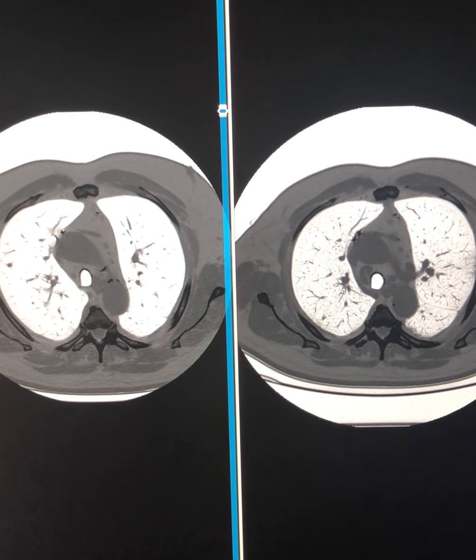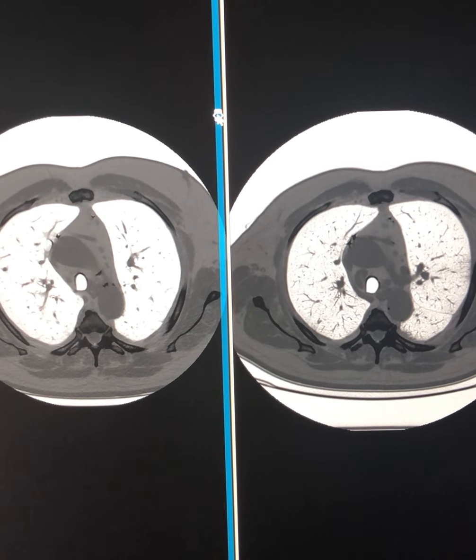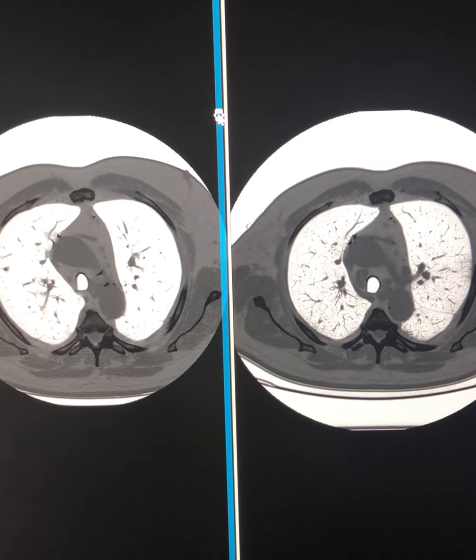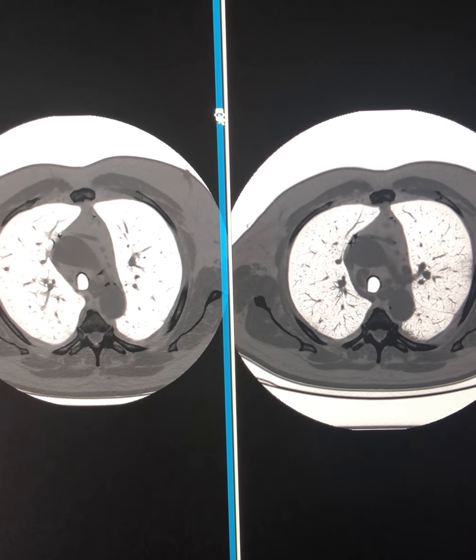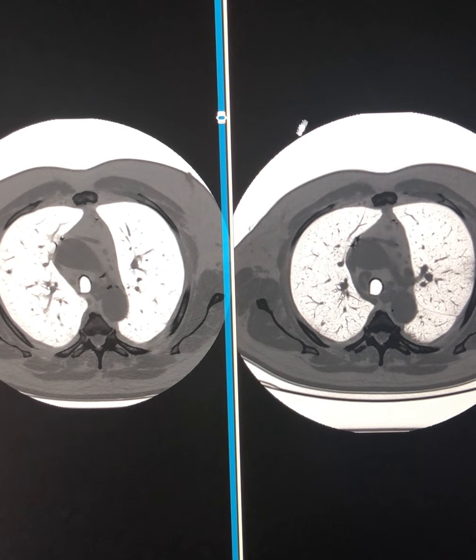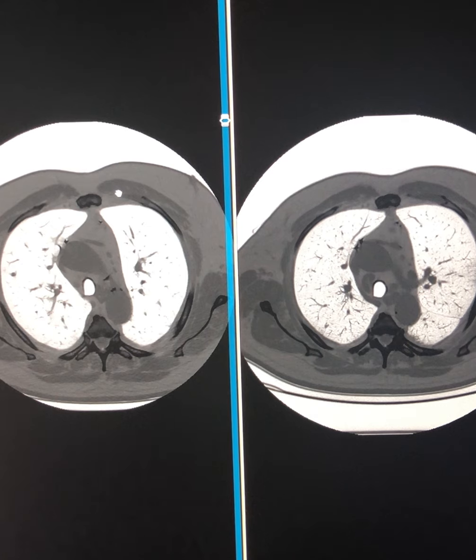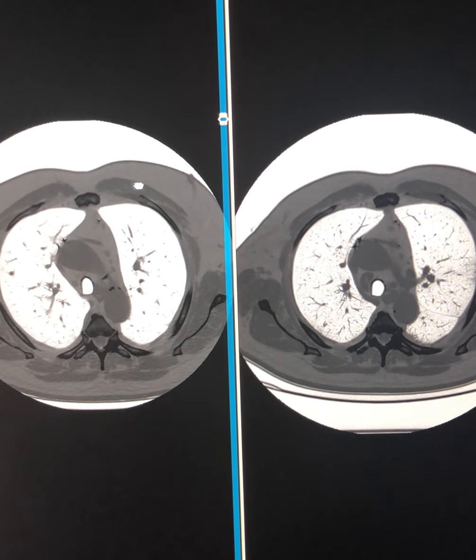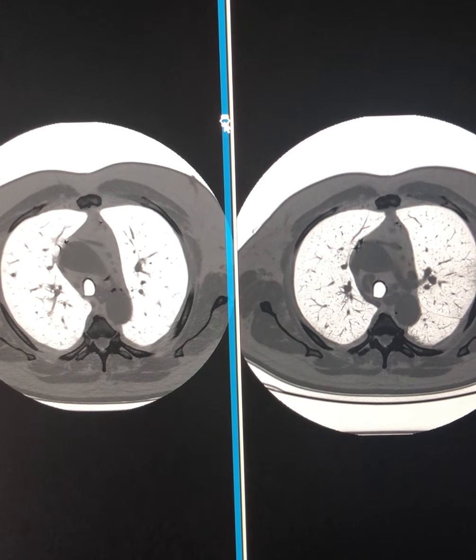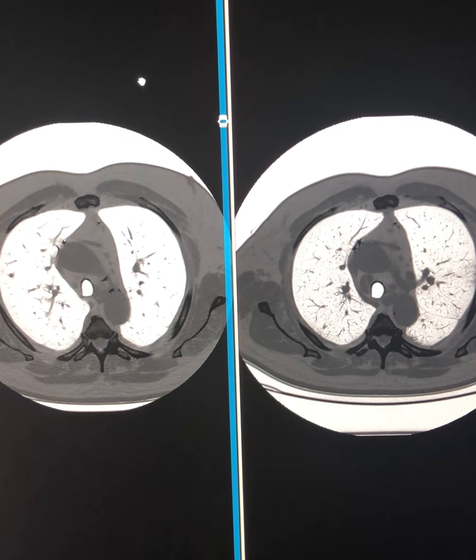In this video, we're going to look at some of the effects of inspiration and expiration on a CT scan and the way things project in the lungs. These are two scans of the same patient done at different time intervals with slightly different degrees of inspiration. It is often difficult to get the patient to breathe exactly at the same level despite extensive efforts. I've inverted the image so you can see the anatomical structure slightly better.